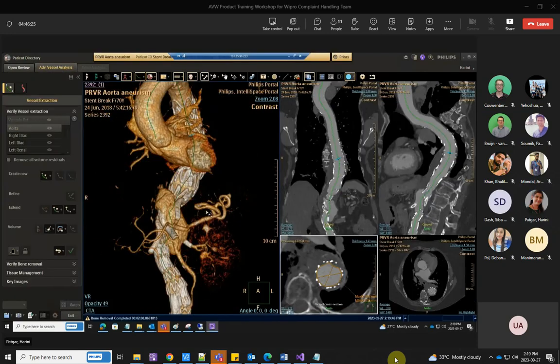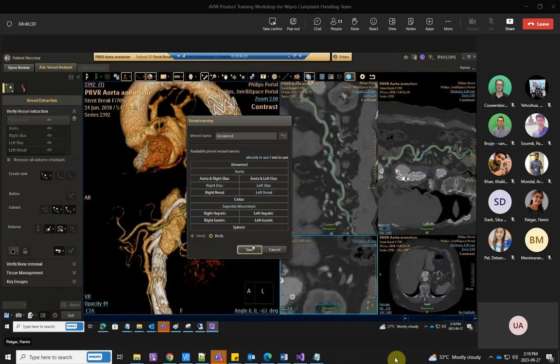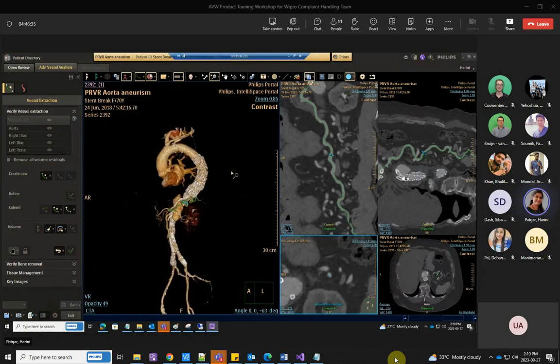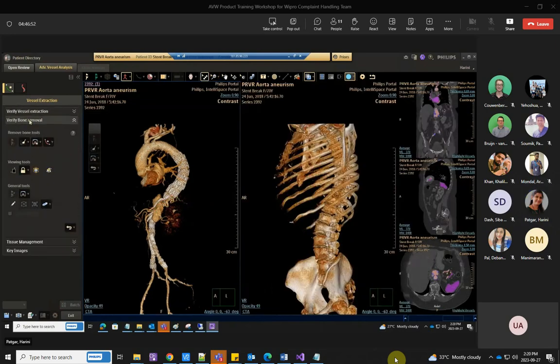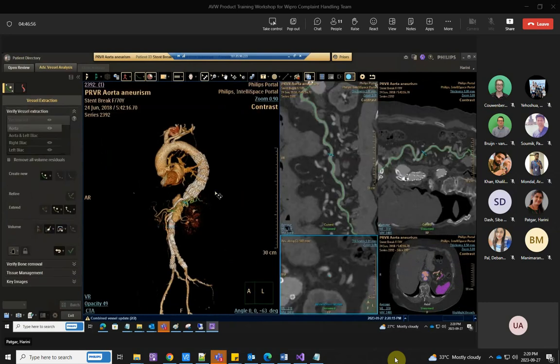Yeah, it's done. Let me zoom back. And okay, still something is going on. Okay, it is taking a little time.